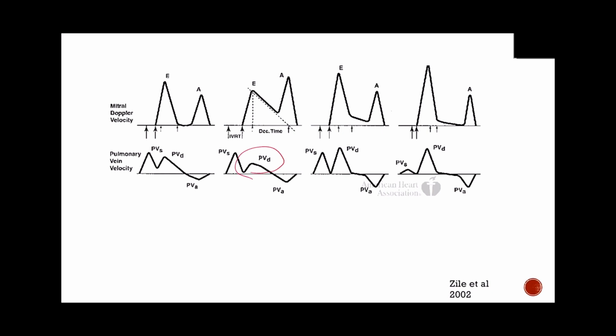However, as we progress in our diastolic dysfunction, we start to see that the systolic motion of the ventricle is probably a little bit less, and you're not going to be sucking blood into your left atrium because the pressure in the left atrium is progressively getting higher and higher and higher, right? And that's what makes us have that pseudonormal pattern, right? That your left atrium gets a higher pressure, and therefore your E wave starts to look normal again. So as the pressure in your left atrium increases, it's going to cause you to have decreasing flow during systole, right, in your pulmonic vein.